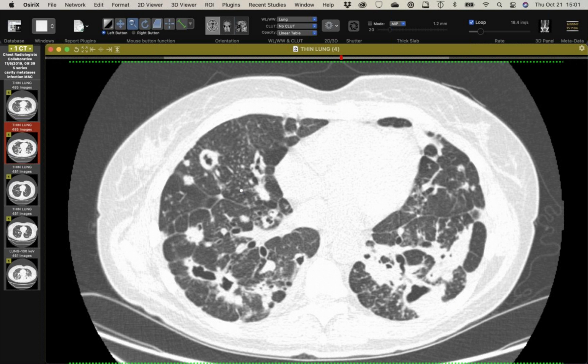Yeah, I think MAC makes sense. You're seeing a bunch of small nodules, which would just represent the granulomas from MAC, and then the cavitary fibrous thickening around it. And the fact that she's not acutely sick makes MAC make sense there, right? I don't know if they'll bronch her or if they're just going to give it some time. But if I get any follow-up, I'll let you know.